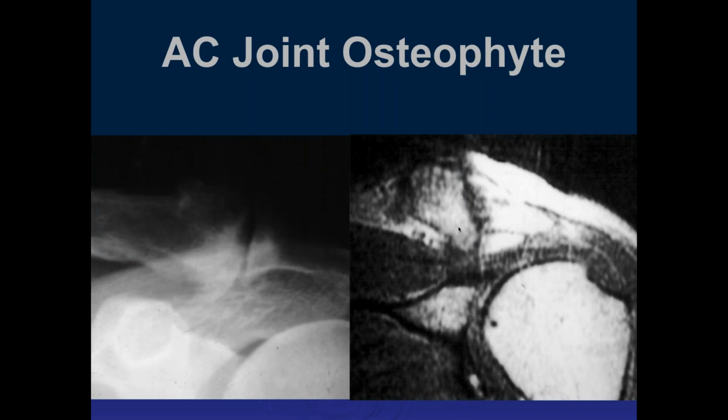So the radiograph and the MR show pretty much the same things. AC joint degenerative changes with a large osteophyte inferiorly, indenting the superior myotendinous junction. This was back around 1990. We used kind of an experimental protocol that flunked, because you can see all the noise on this, but it was good enough that you can actually see the osteophyte indenting the supraspinatus muscle and tendon.